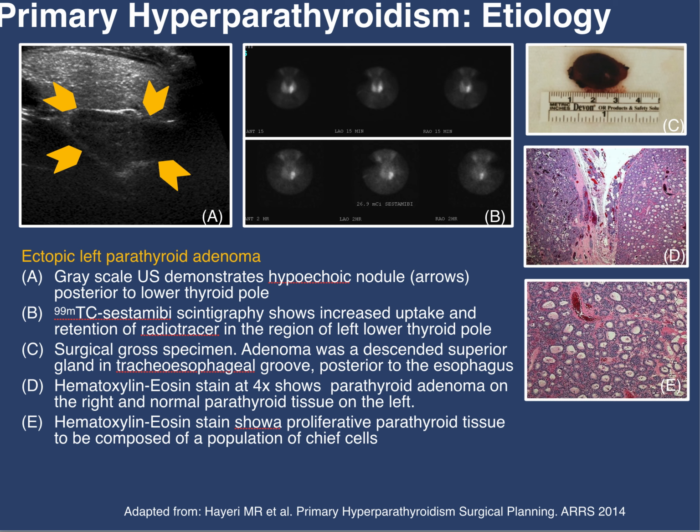So this is primary hyperparathyroidism, and we're seeing a sestamibi scan where on the initial 15-minute images, we're seeing uptake by both the thyroid gland and parathyroid adenoma. The parathyroid adenoma is a little bit hotter than the gland, but still discernible. On the delayed images, at 2 hours, we can see that the thyroid gland has mostly washed out, whereas parathyroid adenoma is hanging on to the sestamibi. And this is the most typical behavior.